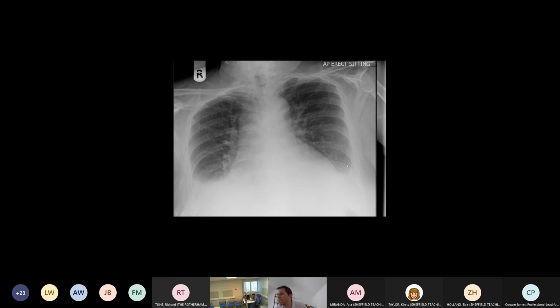We've got consolidation, there's more than just blood vessels going on down here. It's white, it's fluffy, it's ill-defined. We've got a meniscus there, we've got a meniscus there. So we've got, again, all four features of heart failure.